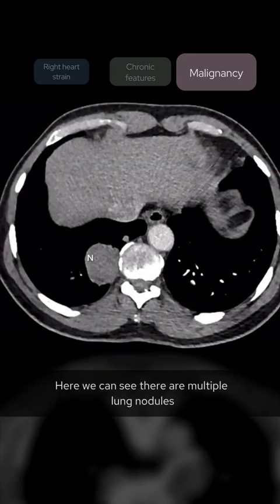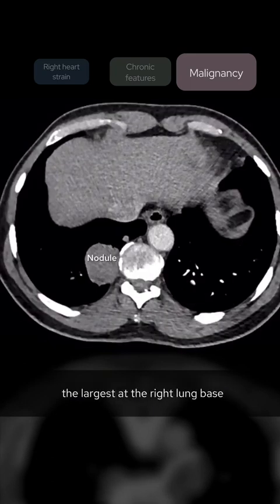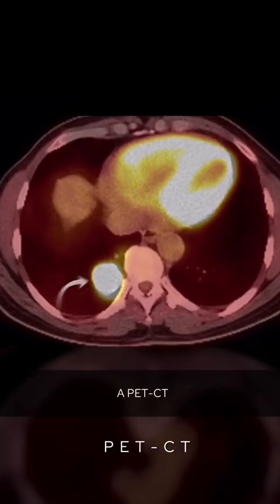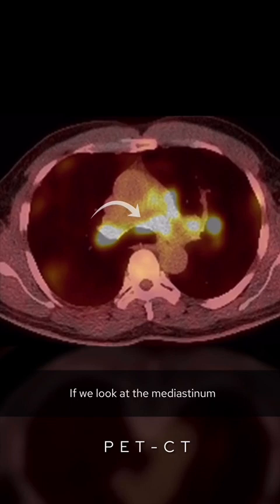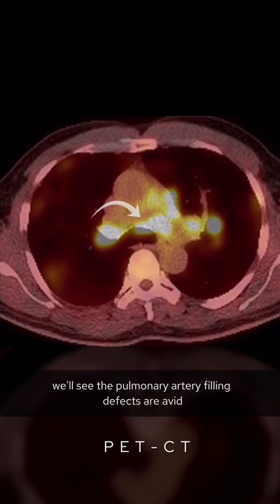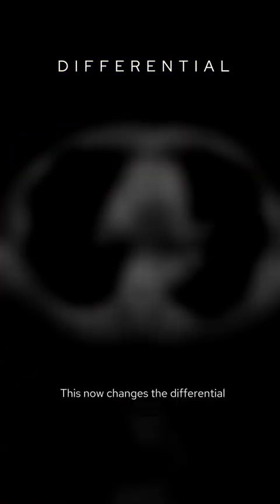And check the lungs. Here we can see there are multiple lung nodules, the largest at the right lung base. A PET CT shows some of the nodules to be FDG avid. However, interestingly, if we look at the mediastinum, we'll see that pulmonary artery filling defects are avid. This now changes the differential.